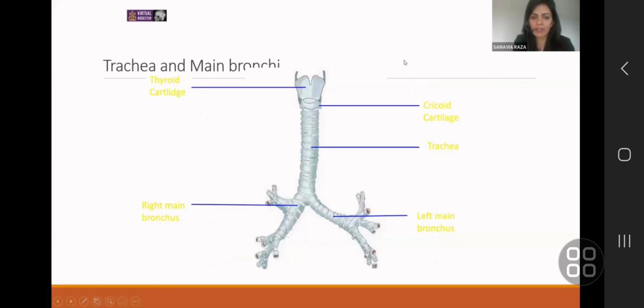In terms of the trachea, again, a huge variation depending on your renal function, your diet, your weight, your ethnicity. Some people have very striking calcification of their costal cartilages as well as their tracheal cartilages. It is important to remember, in most cases, it's normal. The one or two pathologies that have excessive cartilage calcification are very, very rare, and the likelihood of you seeing them is low. When they do happen, they present with symptoms and they present pretty late on.